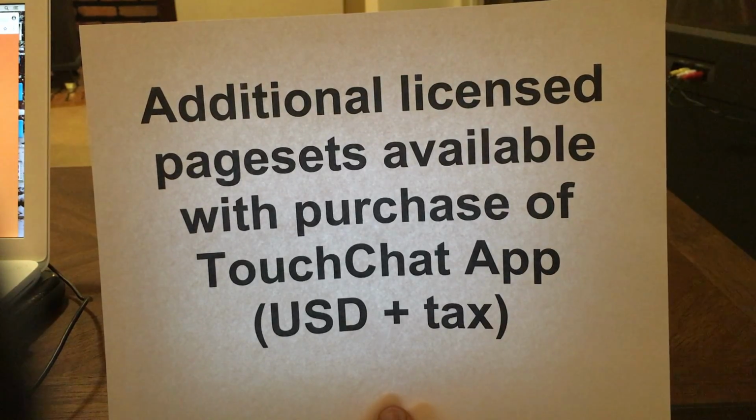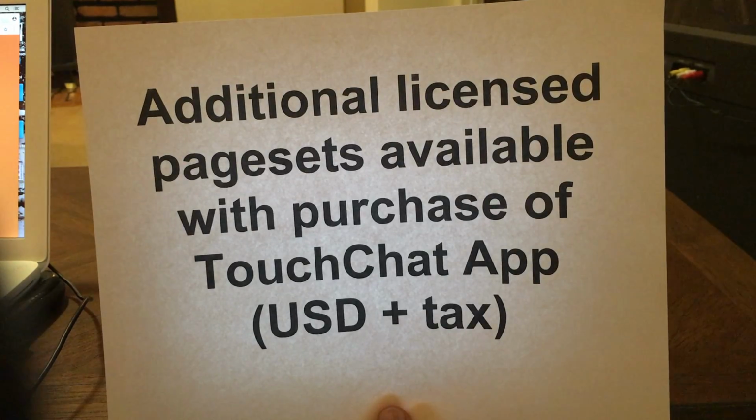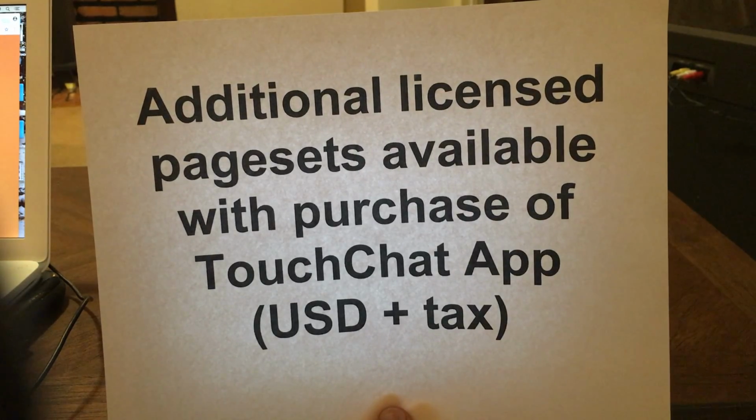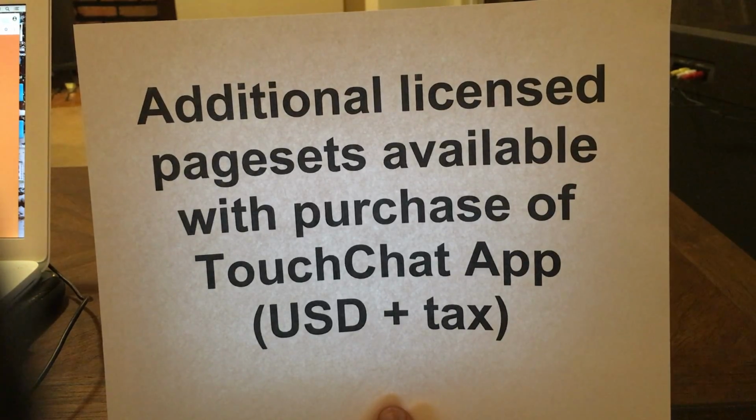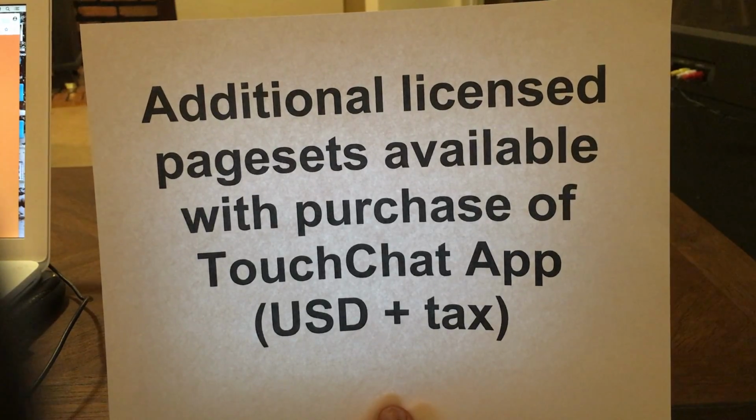word vocabulary. Another additional licensed page set is the Gateway vocabulary, which can be purchased for $150. Gateway is a set of core word page sets which enable creating efficient messages by children and or adults. The theme pages included support AAC use in school, play, and community settings. Vocabularies included in this app are child, teen, and adult. All possible vocabularies are included in the purchase of Gateway.